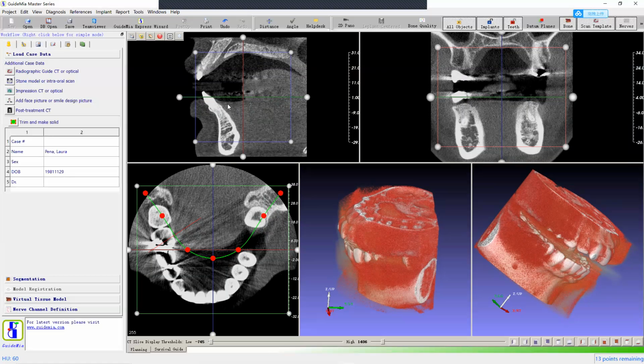So if we move to the teeth, you see the value is 2,157 now, meaning this is high density material. Air is minus 1,000 supposedly. This one got minus 278. Water is 0 typically if the scanner is calibrated properly. Water is 0, air is minus 1,000, and teeth are a couple hundred to a couple of thousand. So that's a Hounsfield unit value.